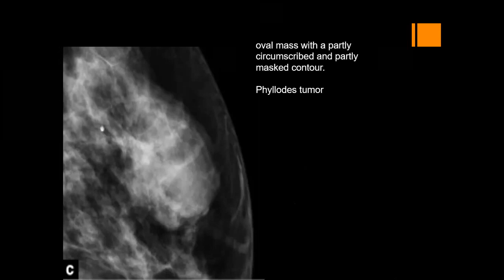And this is serious, because if I report a phyllodes tumor as BI-RADS 2, it will be a serious problem, because the malignancy in phyllodes is unpredictable by imaging. The lesion might appear probably benign on imaging but be pathologically a malignant phyllodes, and the reverse. You might see it as suspicious by imaging and it turns out to be borderline or even a benign phyllodes.